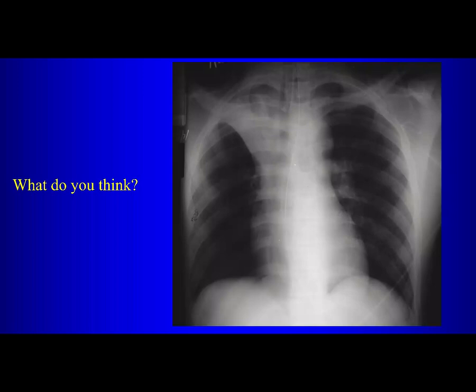left. So to find the hilum, what you do is you find the interlobar pulmonary artery and you follow the trajectory back towards the mediastinum, right? And that trajectory tells you the position of the hilum. So this hilum is located here, this hilum is located over there. So that right hilum is slightly higher than the left. So elevation of the hilum is always a good sign for volume loss in the upper lobe, whether it's the right or the left. Okay?